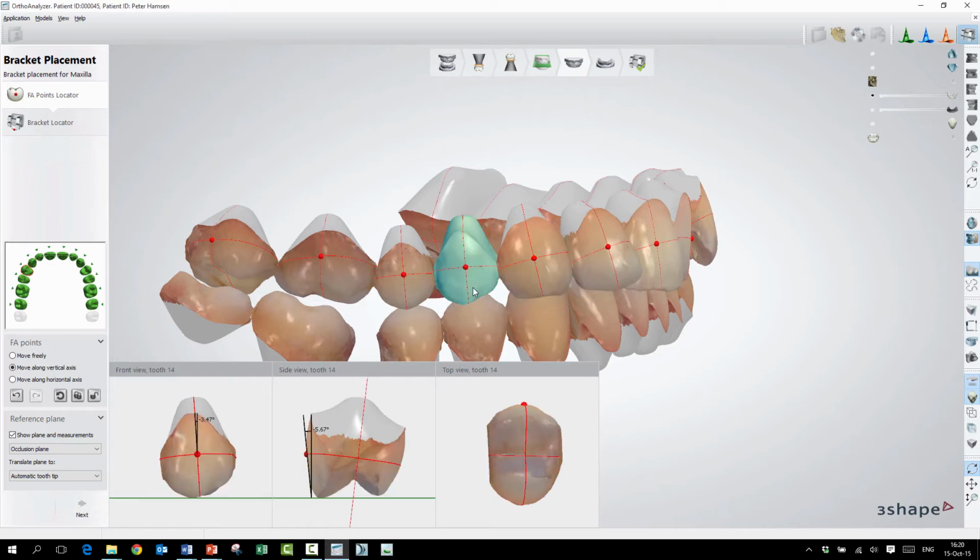So this is also a way to express the malocclusion of the patient in absolute terms, which is also a new feature. And it's summarized at the end of the process, we'll see, in the table that we have. So that really expresses the malocclusion of the patient in absolute terms. Whereas before we were just looking at the situation and then making movements in the treatment planning process, for example, that were all deviations from the malocclusion, but the malocclusion was like the 0. Just a little comment about this, but this is also new, additional clinical information we get about the treatment.